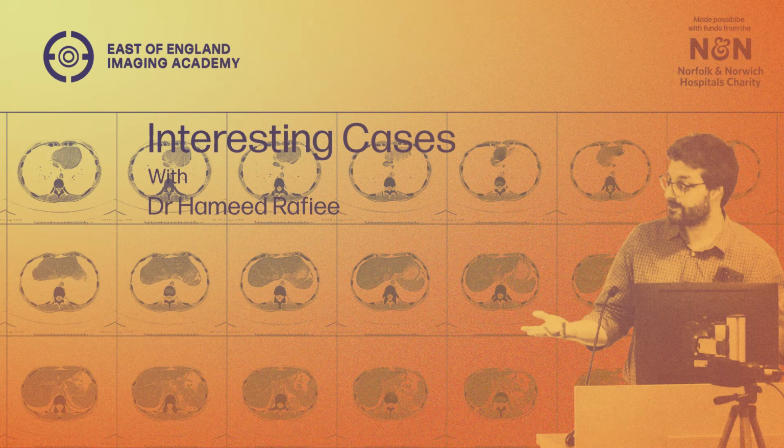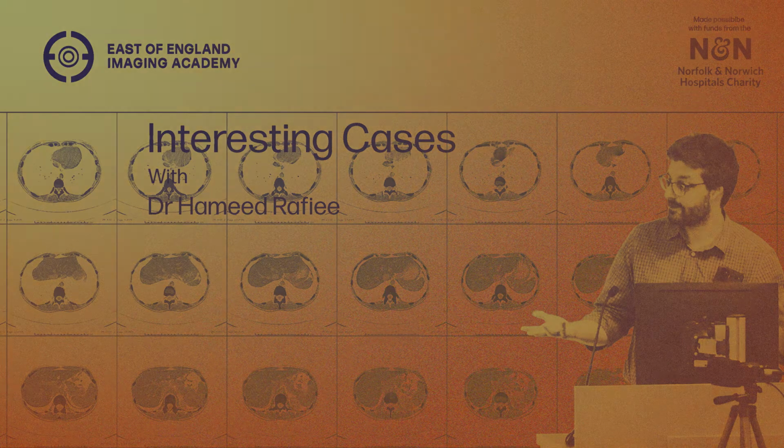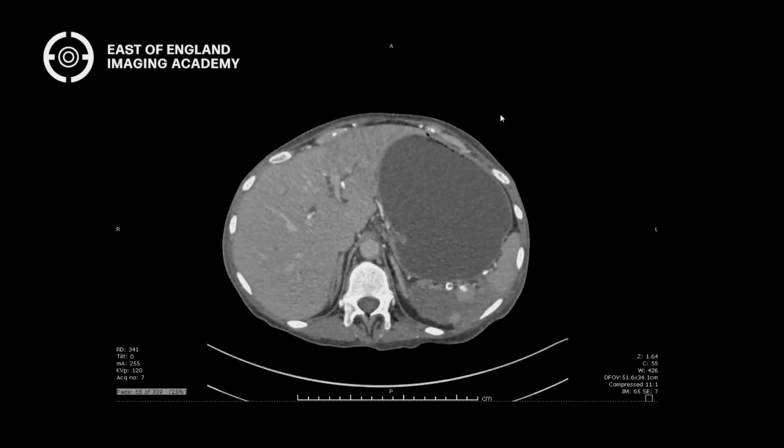And let's talk about a different concept. So we're talking about contrast enhancement. Obviously, you're looking at lesions that might be enhancing, but you're also, don't forget, you're also looking at the enhancement of the organs themselves. Okay.